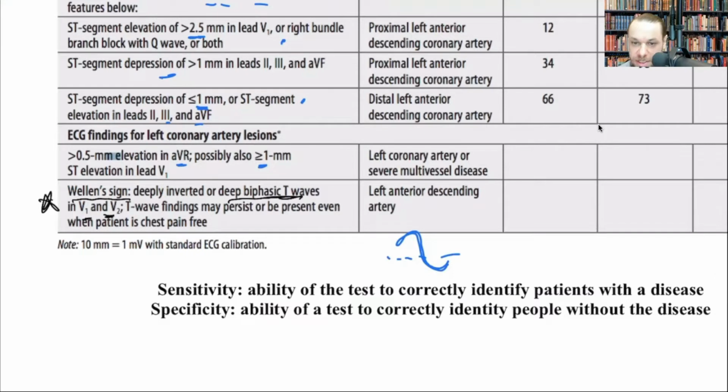This biphasic T wave, even though it's not a STEMI, right, it signifies there's left anterior descending artery blockage, right? So you wouldn't be able to per se activate a cath lab, but I would definitely transmit it to the telemetry and notify them that you believe they have this Wellens, and definitely inform the doctor at the receiving facility. Hopefully, take them to a cath lab capable hospital, right?